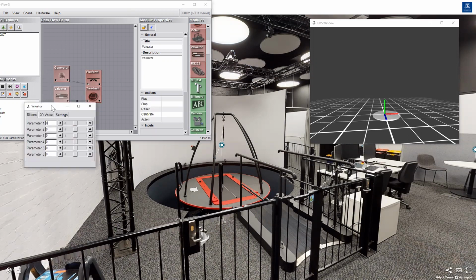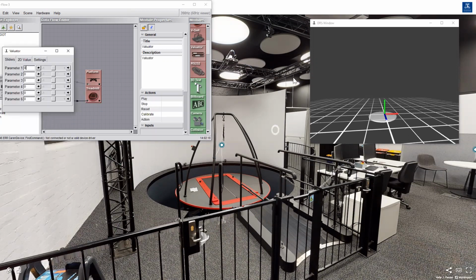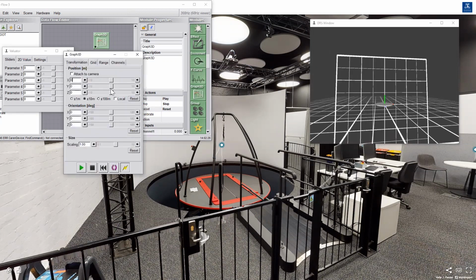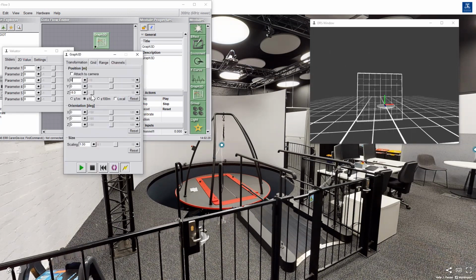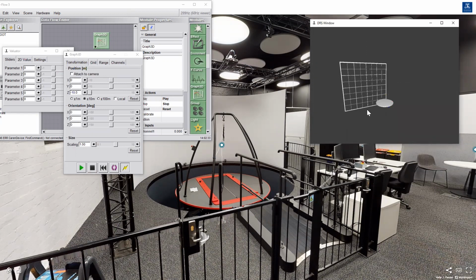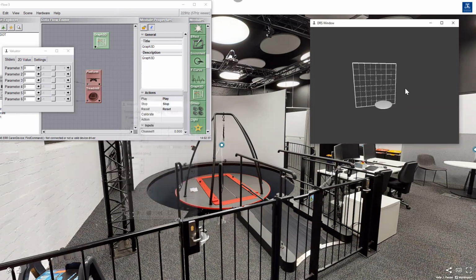And then if you look at it, because I don't simulate it here, I emulate it here, I can bring, for instance, a kind of graph, right? And that graph can go 3D, okay, can go back so that we can see what's happening here. I clear things for you, and in the meantime, that would simulate these VR examples, okay?